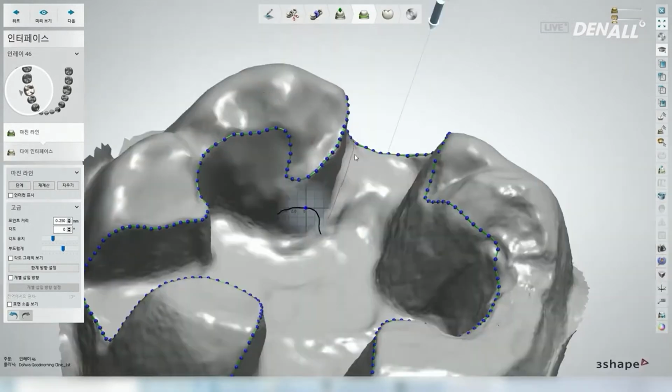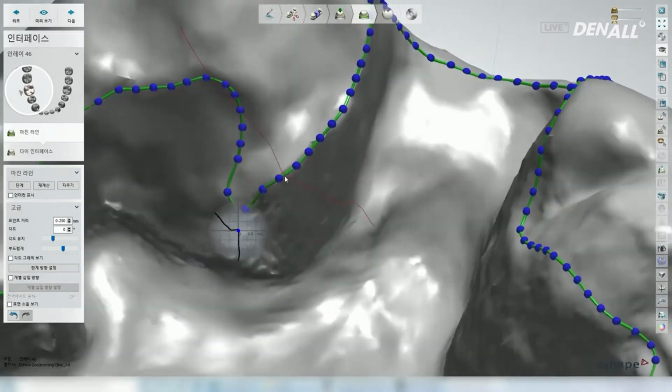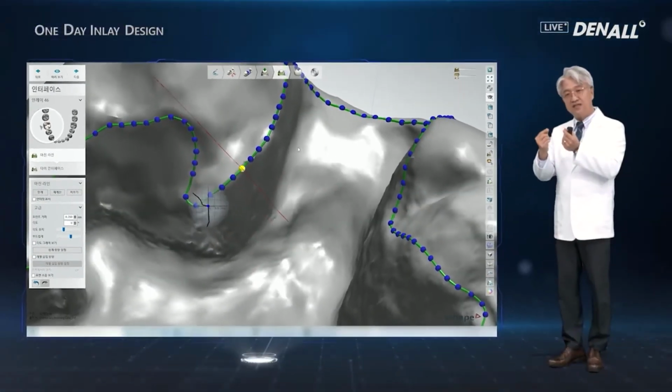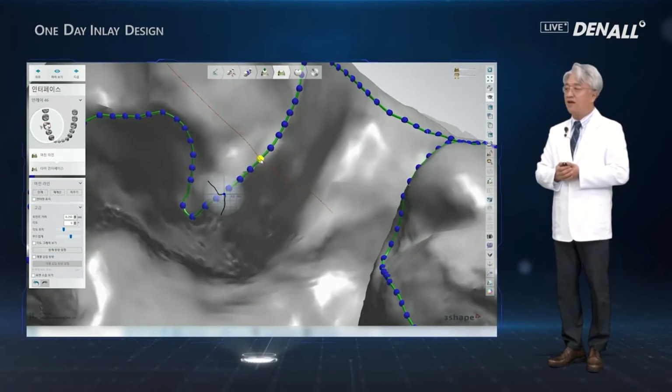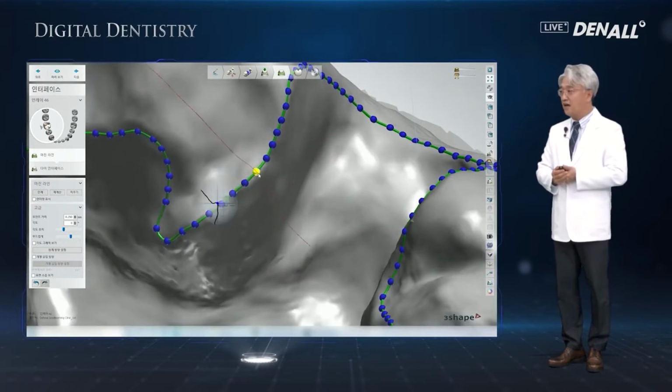And this border area, the inlay borders are like knife edge, very thin, but can be printed with the 3D printer. But in milling, if you cut, it can break because it's thin. So you have to take that into consideration in prep to have a good inlay result.